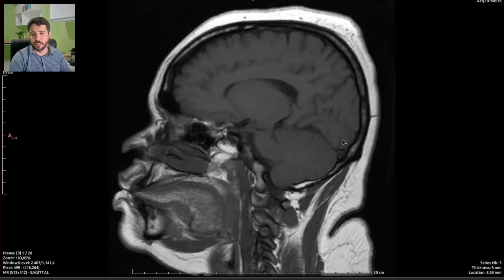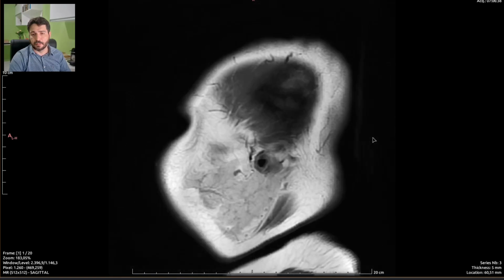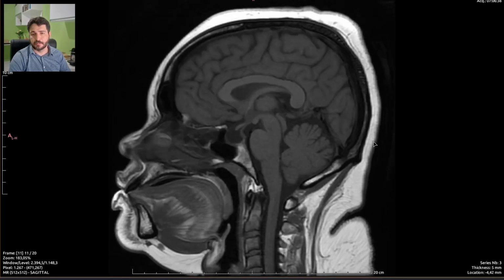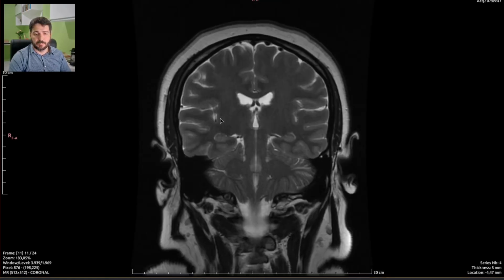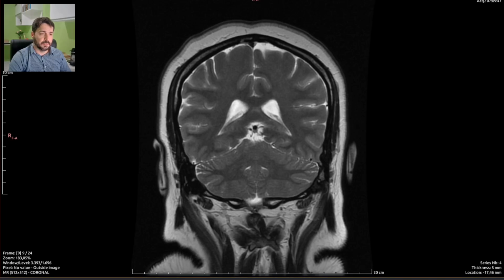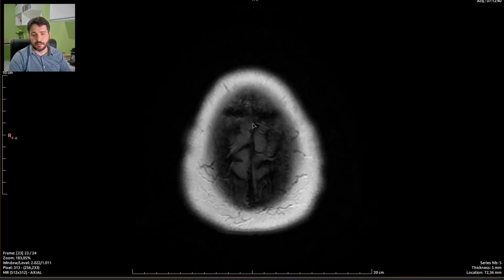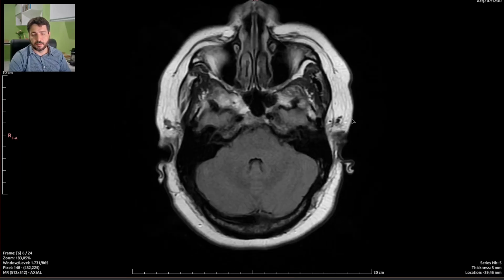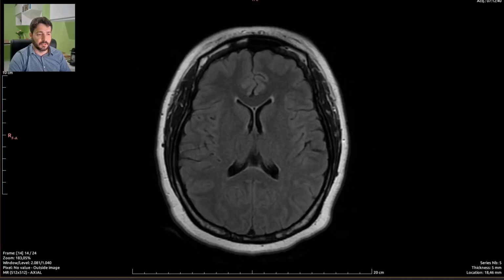It is right here on the joining of the sinus. They repeated the entire brain scan and then did an angiogram, which makes no sense. This is just to waste time.